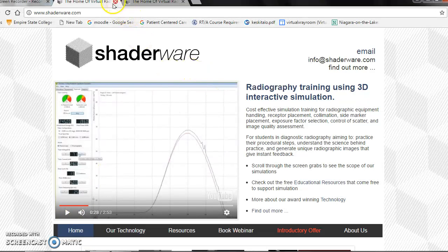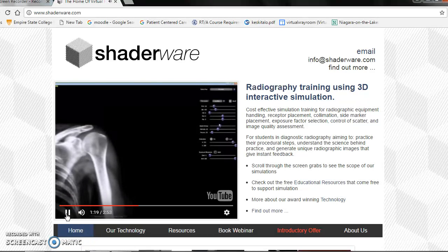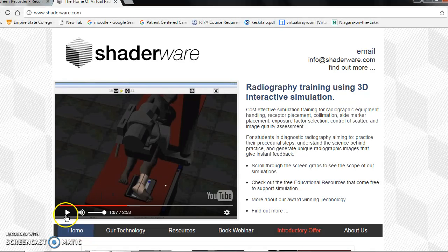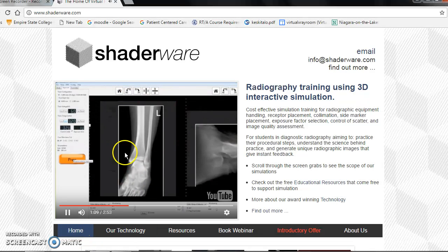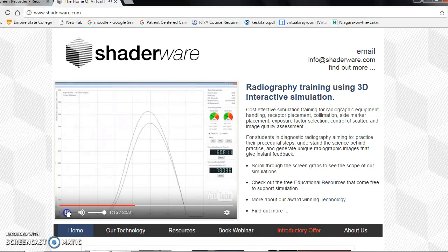All right, so I'm going to move on to, let's see, image evaluation. Okay, so with image evaluation, we can actually rotate the image around to get it where we need it. I'm actually going to back up to this right here, to 108. So here's our image evaluation that we're going to compare to another, finished image. And again, you can see the histogram that's created there.